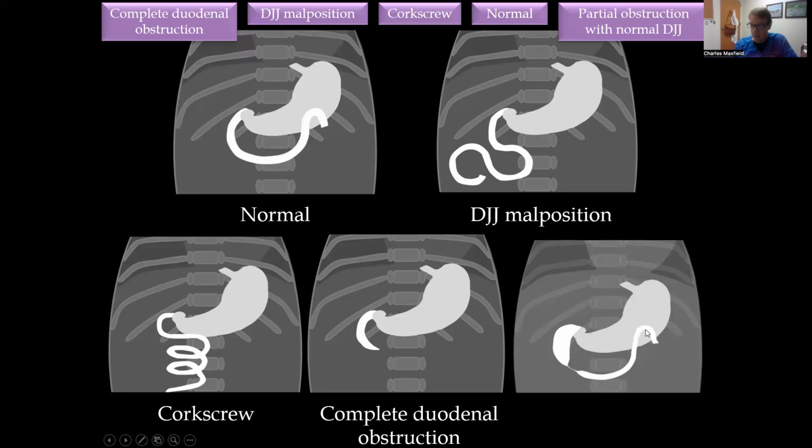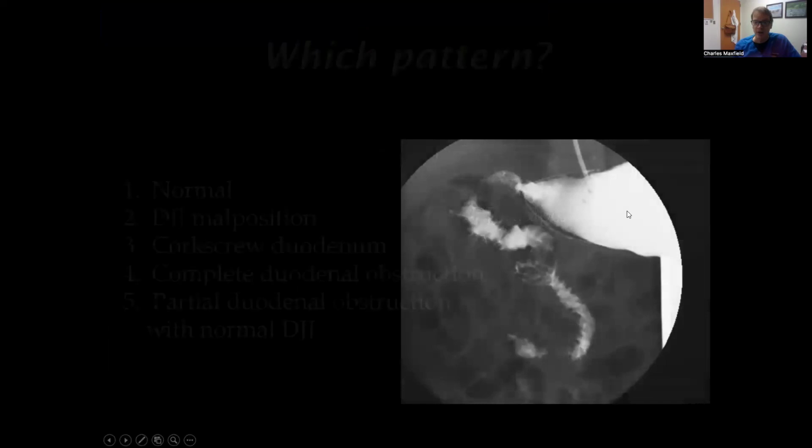So this rules out malrotation and therefore rules out volvulus. So that's really important to do if you can get enough contrast through to rule out volvulus, because this child's probably going to need surgery at some point to take care of that obstruction, but not tonight, not in the middle of the night, doesn't need to be rushed to the hospital if they can do the surgery, because we've shown that he's not volvulized, which is the only bad diagnosis which is really emergent and you're really on the clock, okay? So those are our 5 patterns.